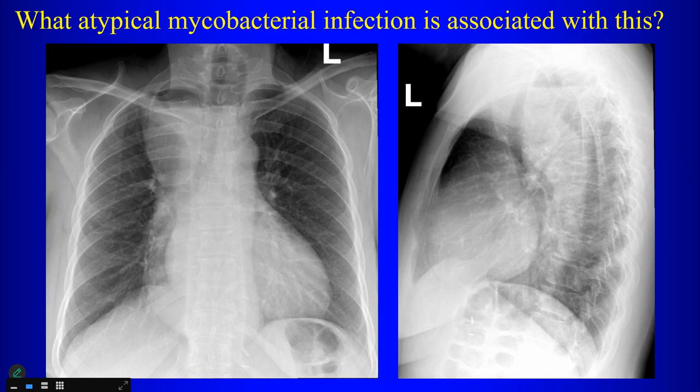Achalasia. How do you know? Looks like there's an opacity posterior to the trachea. You're right. This opacity follows the contour of the esophagus, posterior to the trachea. That's where the esophagus lives, right? And then you have this density here, right? What am I pointing to here? This is the right heart border. There's this opacity that's coming down below the diaphragm, lateral to the heart border. That represents what then? Esophageal line. Yeah, because of the dilated esophagus. That is the dilated esophagus.